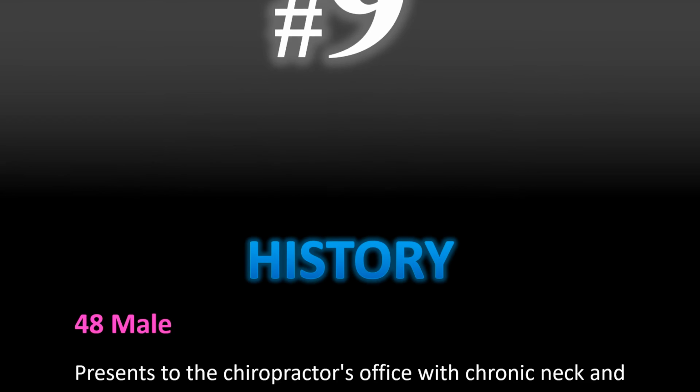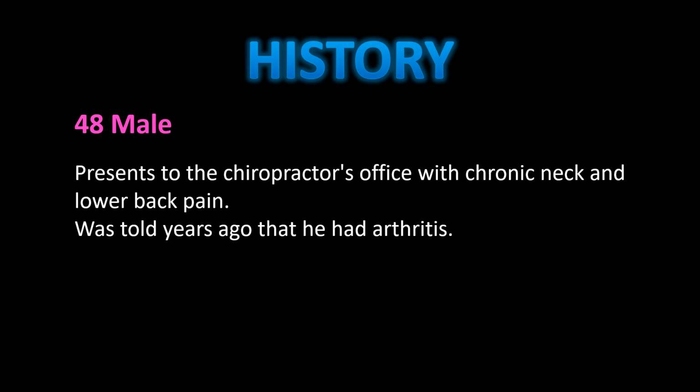Case number 9. A little history on this patient. This is a 48-year-old male who presented to the chiropractor's office with chronic neck pain and chronic lower back pain. And he was told years ago that he had some type of arthritis, but he couldn't remember what that was.